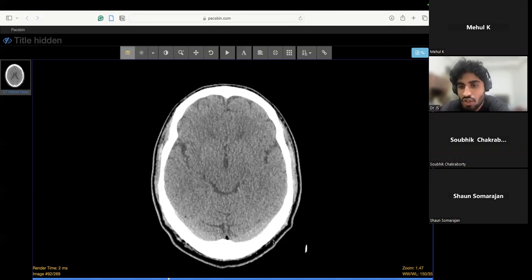Okay. So now here we come to a term known as windowing. Okay. There are multiple windows, like window at a high level, window at a low level. So we need to know these terms so that we can navigate through these pictures. These are images stacked together. You have heard about the terms bone window, brain window, and other various aspects, right? So there is a WW and WL. WW is window width. You can see window width is 150 and window level is 35.